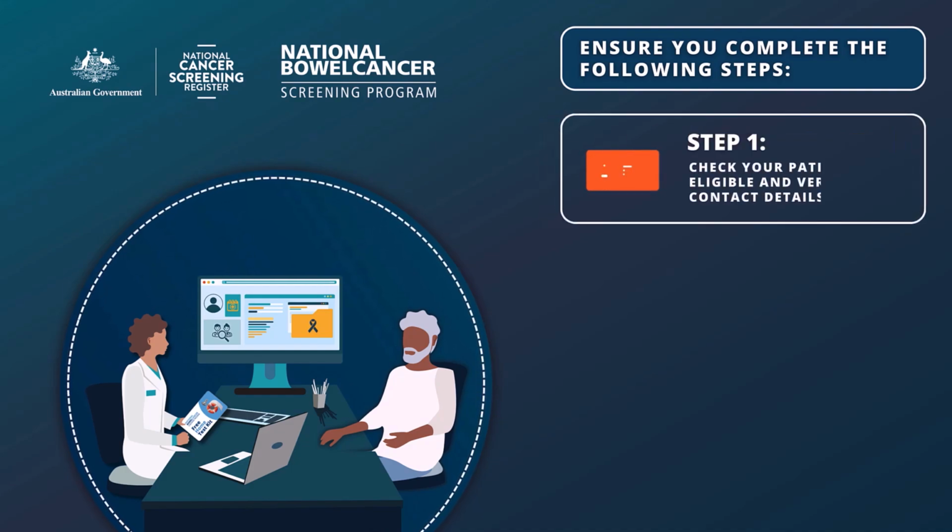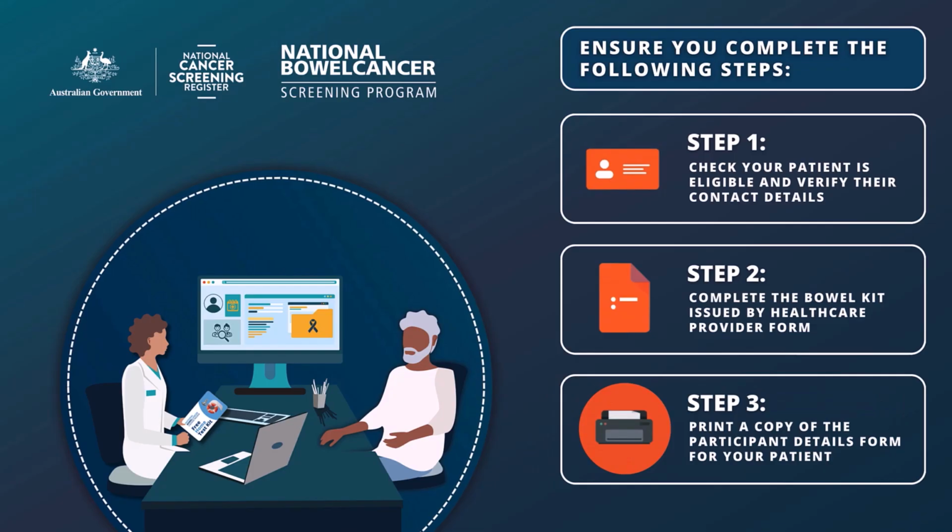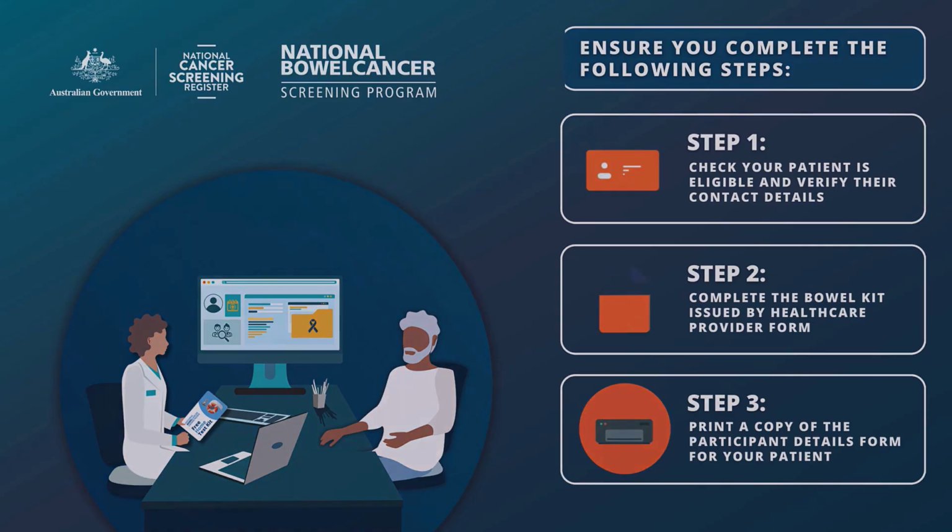First, check that your patient is eligible for the bowel screening program and hasn't screened in the last 2 years, and that their contact details are correct, and make any necessary changes. Then, complete the bowel kit issued by healthcare provider form to generate a unique pre-populated participant details form. Then, print a copy of the participant details form and give it to the patient to sign and include with their samples in the reply paid envelope, which is enclosed in the kit.